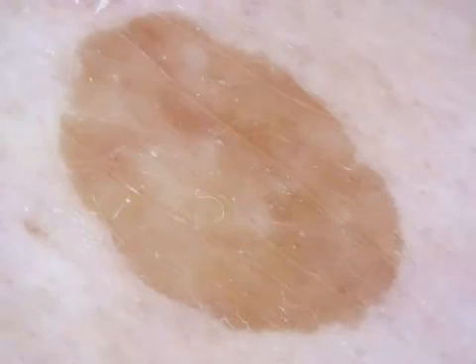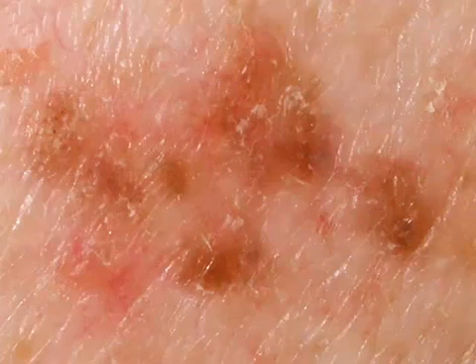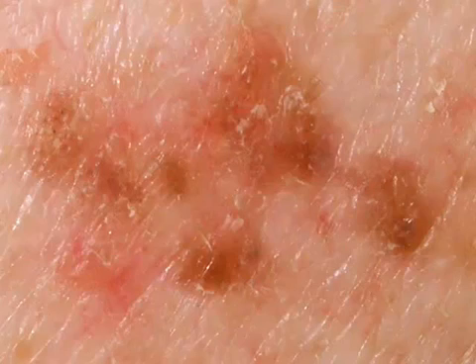Structureless brown, as I already said, can be a flat seborrheic keratosis or a solar lentigo, as in this case. This lesion here, clinically, is scaly. Dermoscopically, it has only one pattern, structureless, and one color, that is brown. Now, it's not a solar lentigo, and you have to look for clues. It's not a nevus. The clue here is that we have the structureless pattern, but also some coiled vessels identifiable here. So in combination with structureless brown pattern and coiled vessels, the diagnosis is pigmented Bowen's disease.